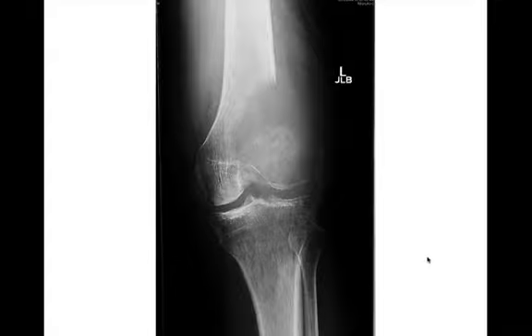All right, so we have a frontal radiograph of the knee here. We have a geographic lytic expansile lesion, which has a wide zone of transition. It's destroyed part of the cortex out laterally here. A wide zone of transition, right? You can't see really a nice sharp margin around it, though it is a geographic lesion. This lesion is in the metaphyseal epiphyseal portion of the distal femur and is eccentrically located.